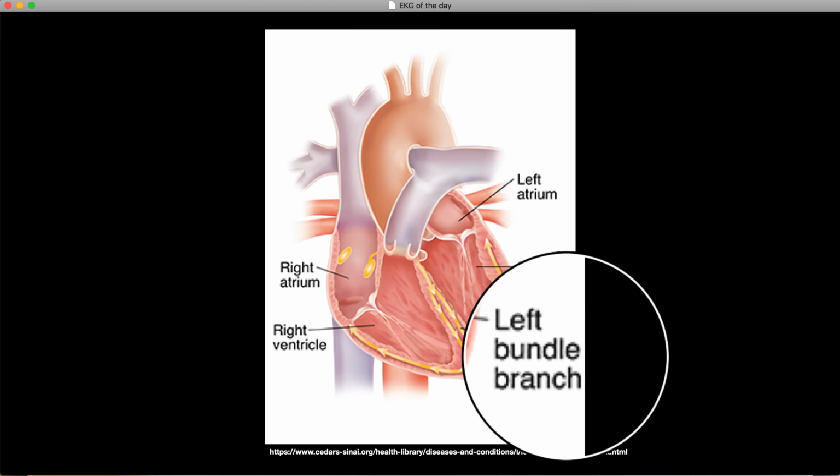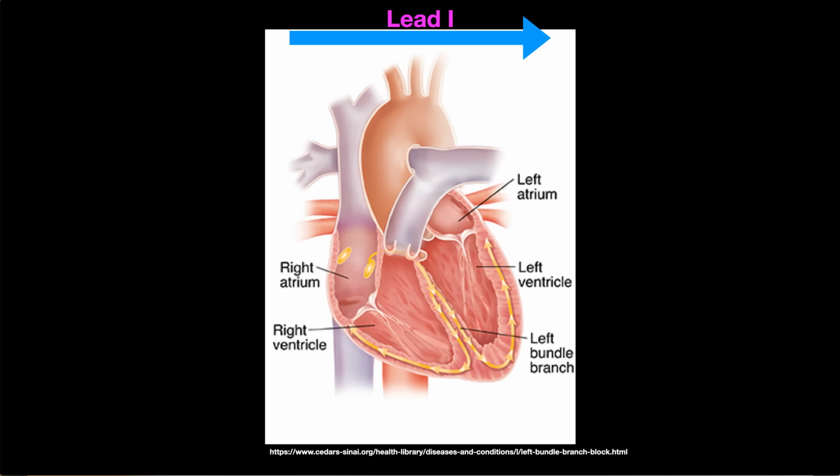So if you lay across the EKG leads, lead 1 goes your right arm to your left arm if you're the patient. Lead V6 and V1 are the edges of the precordial leads. And this is, again, if you picture V1 and V6 coming out of the paper at you in a horizontal plane with the other V leads kind of running between them.